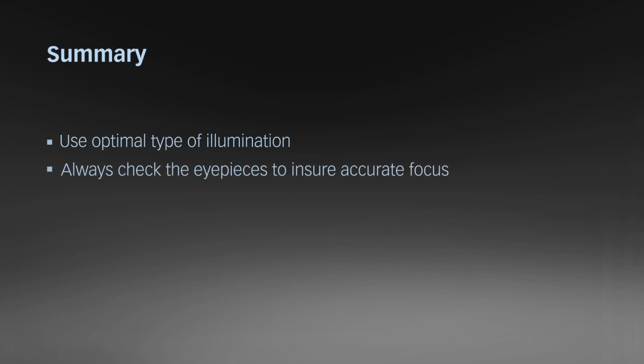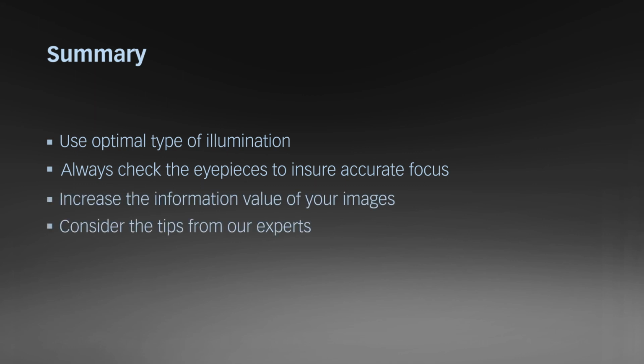To get the most out of your slit lamp imaging solution, use the optimal type of illumination. Always check the eyepieces to ensure accurate focus. Increase the information value of your images and consider the tips from our experts.